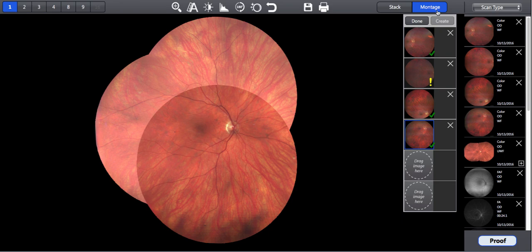So those are the features for this portion of the Analyze section of this imaging system. And this was created in Axure.